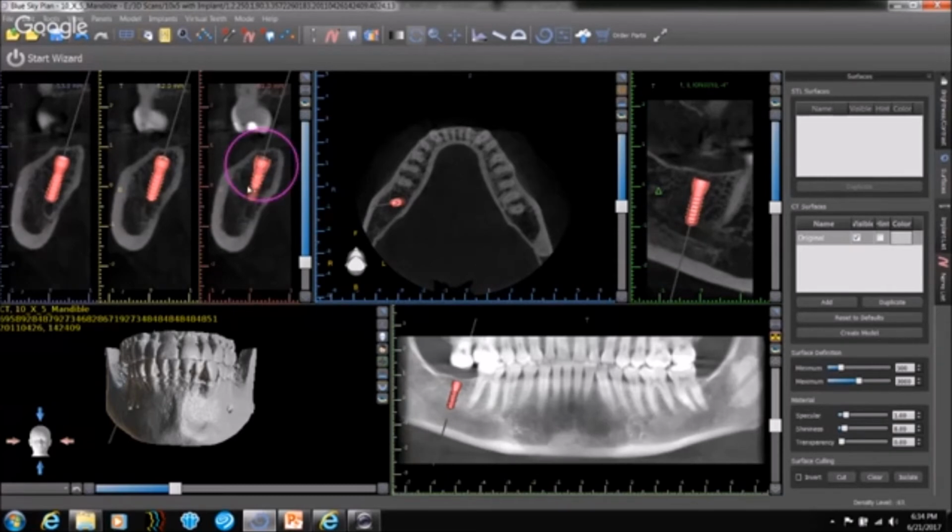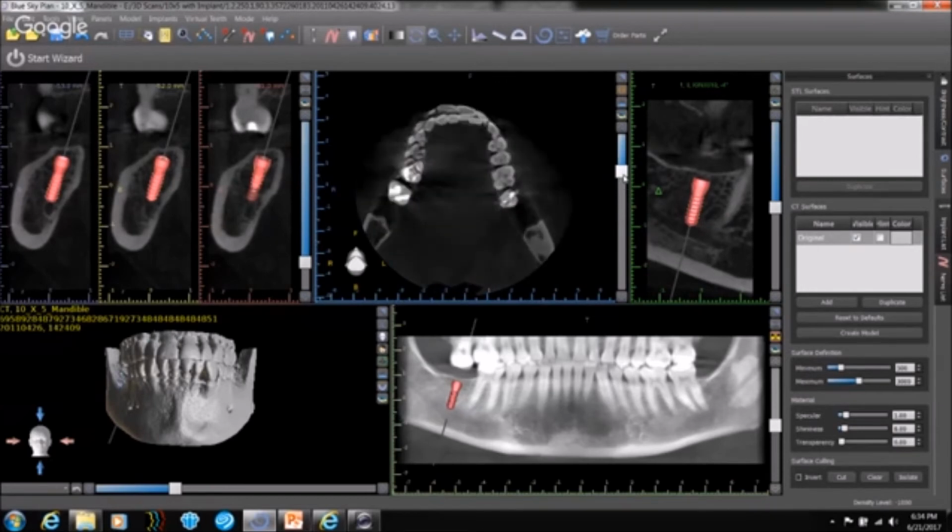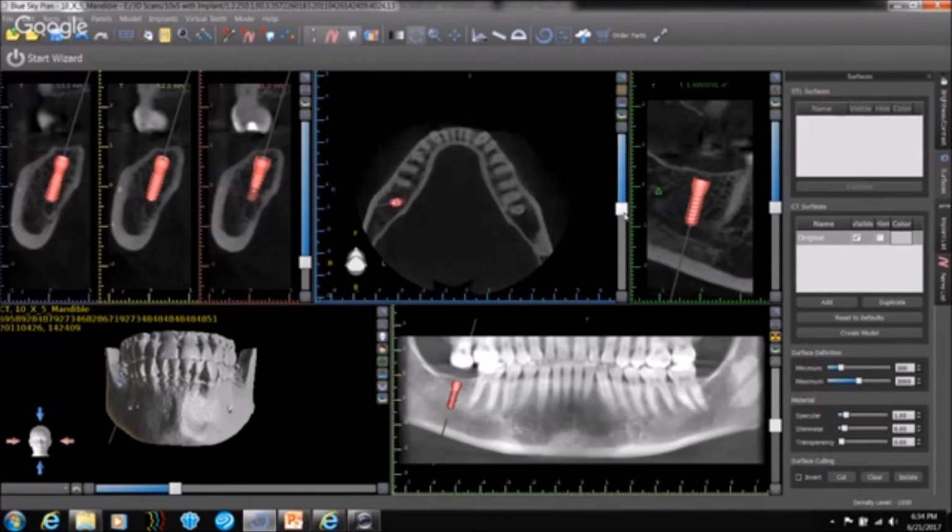So the size of the implant is determined by the site, by the angulation, and the type of the procedure that you pick. So it's a very simple process. Like I said, typically as a process of continuous evaluation, I would recommend evaluating the entire jaw just for the sake of completeness. Now, there's a little bit of an interesting factor in this particular slice.